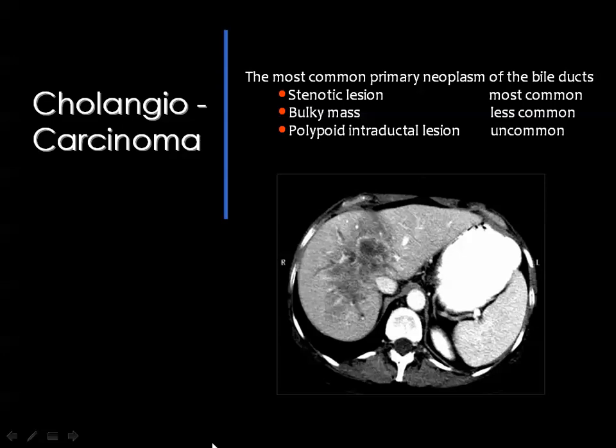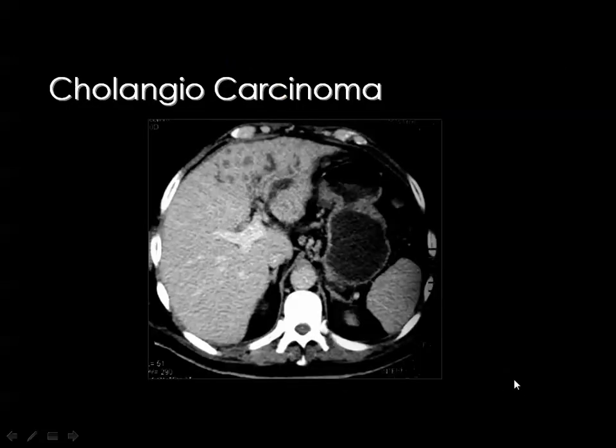Then if you see dilated biliary radicals through the liver, then you remember that for the malignant focal lesions in the liver, we have stated 4 common lesions, including the hepatocellular carcinoma, cholangiocarcinoma, lymphoma, and metastasis. And you remember that cholangiocarcinoma is diagnosed by the presence of an infiltrative lesion in the liver parenchyma surrounded by dilated biliary radicals. And this is the intrahepatic type of cholangiocarcinoma.